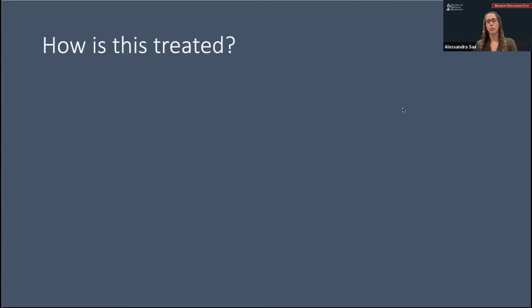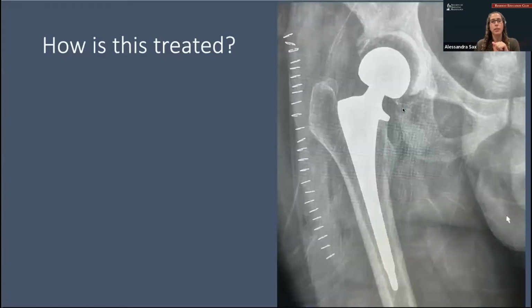There we go. This isn't a Poll Everywhere question, but because of the bone infarcts and the fracture, this was treated with a hip replacement. And if you just notice, the acetabular component of this hip replacement is probably double the thickness of what a normal hip replacement acetabular component is. This is actually an antibiotic impregnated acetabular component to this prosthesis.